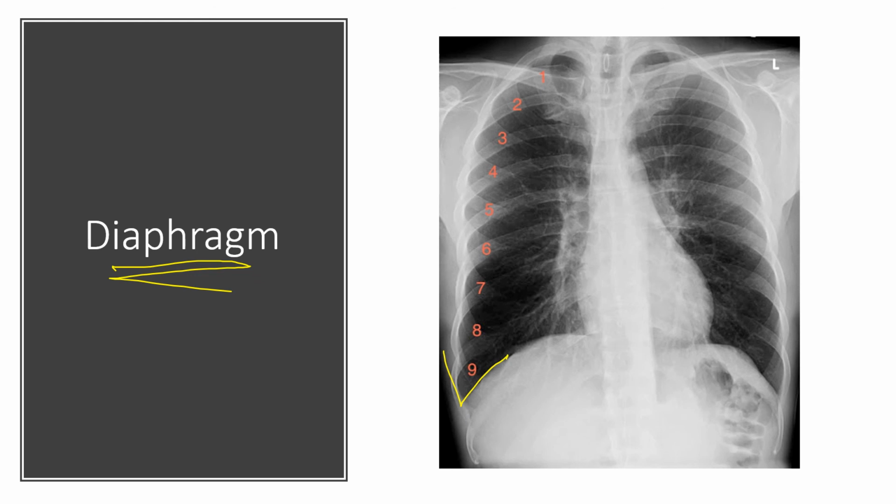So here you're counting the ribs, and normally you should see roughly about 9 ribs of expansion. Remember, these are all posterior because they curve down. They start at the spine, curve up, and then down, and then you can sort of see the shadow of it coming. I'll use a different color. You can see the shadow of the anterior rib there. So that's sort of it coming down towards the front, but the x-ray is penetrating further than the anterior ribs.